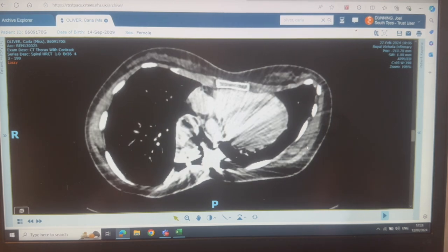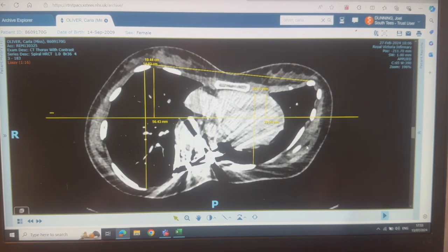Just in this person, made that decision myself. And then just got the dip to do, and weirdly, dip was quite small because she's so strangely asymmetrical. Not perfect that, but yeah, the dip's tiny in this person, strangely. So that's how I've measured this one.